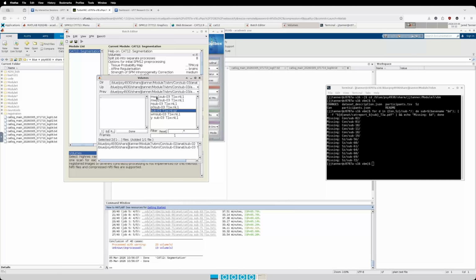That's this sub file. There are going to be other files created, very likely. Don't put those ones in. That will be a problem. And then single click up. So I'm going to do the process. I'm just going to pause the video at this point and come back once I have them all added.